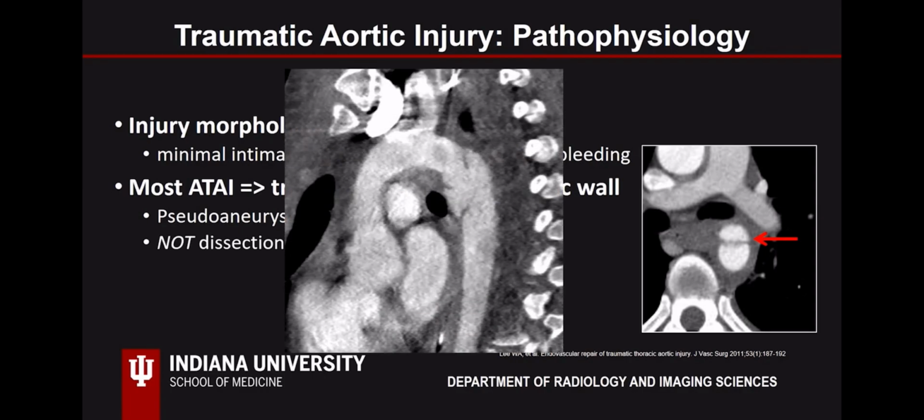If we look at this image in the sagittal plane of another patient and imagine yourself scrolling from top to bottom, you encounter this level where you have contrast surrounding an intimal flap in a patient with a large pseudoaneurysm.